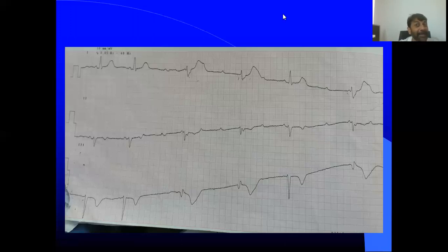And how did you pick that? Apparently you are saying that this is complete heart block. How did you pick that? When you applied those five principles, everything is under those 5 principles. When you apply those 5 principles, you will find that this thing is not fitting in this condition. So certainly in that situation, you have to judge and find the other thing.